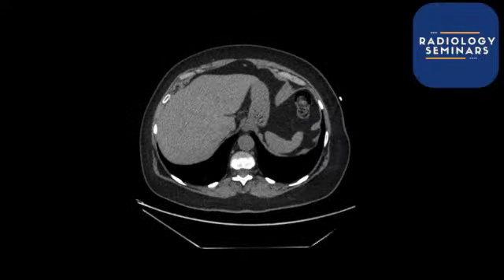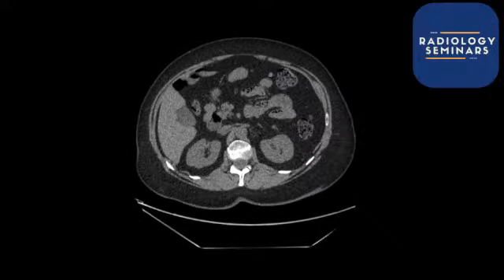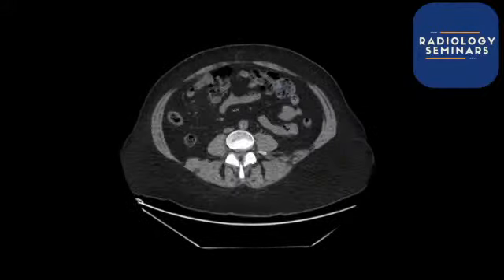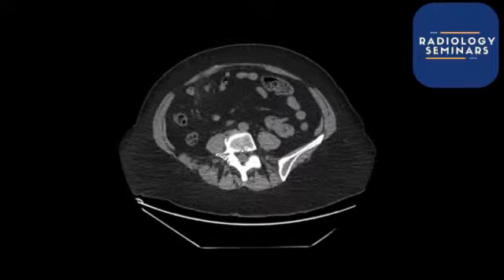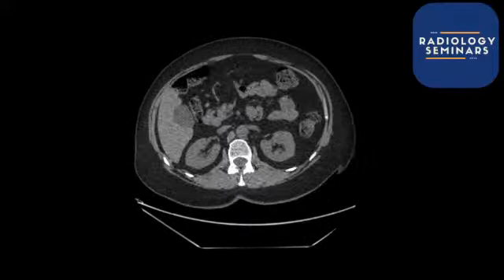This is now the splenic flexure, and we're coming across to the transverse colon, going right across. So we can see my mouse is just sitting there, and we're dipping down and then straight across to this side. You can hear my mouse wheel going round, and that's because that's how I like to follow the bowel. I take it a little bit more slowly than I otherwise would with the other structures.